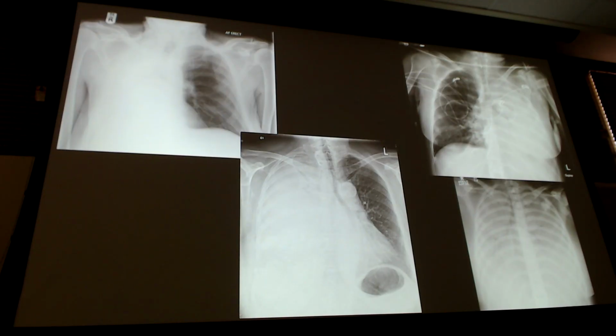What's going on the other one? I don't know. It's in there. I don't have any other. The thing with this one, right? So this is showing you that we could have multiple things, right? So I see the air bronchograms. That makes me think pneumonia, right?